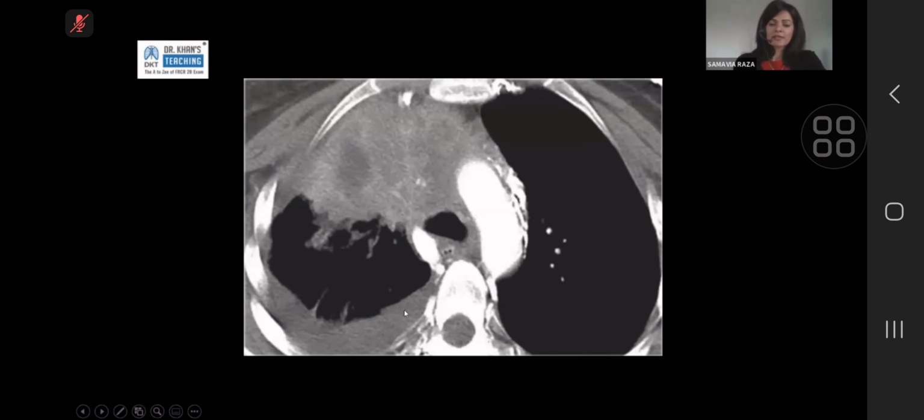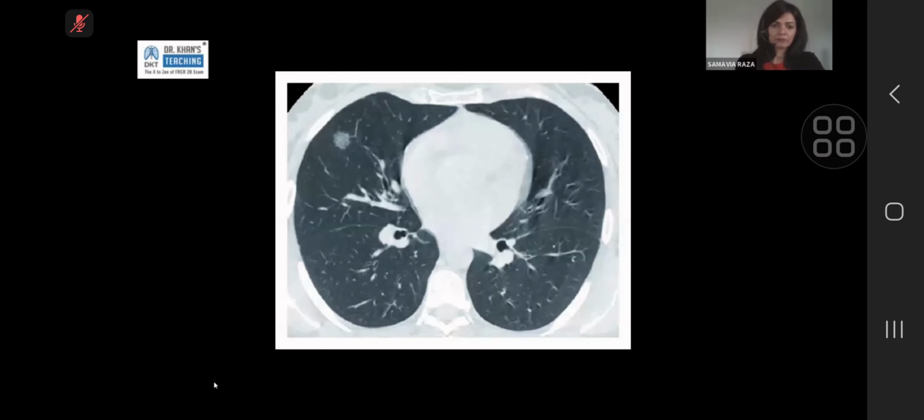The pleural effusion in this case also would be a malignant pleural effusion. If this lesion was a small 8 millimeter nodule and this pleural effusion was here, the likelihood of this pleural effusion being malignant would be extremely low. But because you can see that this is infiltrating into the pleura, the visceral pleura is definitely involved, you can more reasonably say that this pleural effusion is actually malignant, and in this case would upstage the staging to M1A.